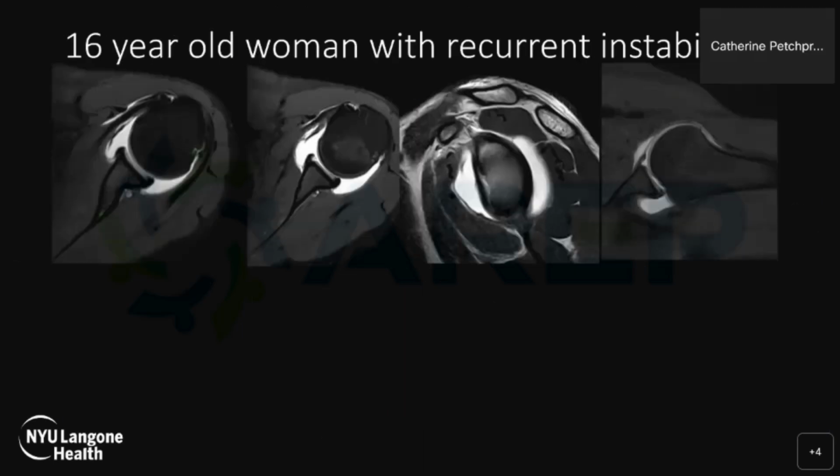This is a 16-year-old woman who presents with recurrent instability. Her Hill-Sachs lesion is shallow and wide, but extends pretty medial, and there's very little glenoid bone loss. It doesn't seem like much.